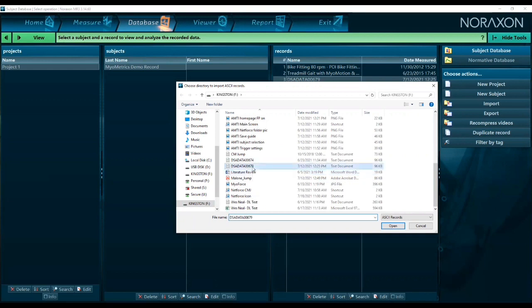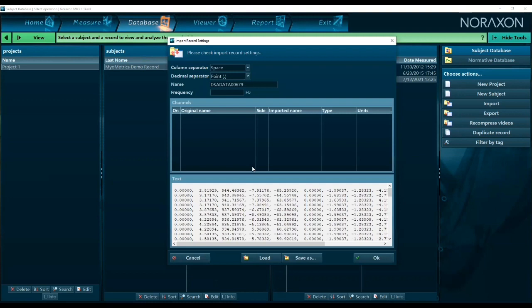Okay, now on this screen, it's very important to follow a number of things. First things first, we want to make sure that we're measuring at the hertz frequency that we were, which was 200. So we'll click that in there, so that it will allow the MyoForce software to interpret our data. Now we're going to try to get the channels. Remember, there's 12 channels. So the goal is to get those 12 channels to pop up here.